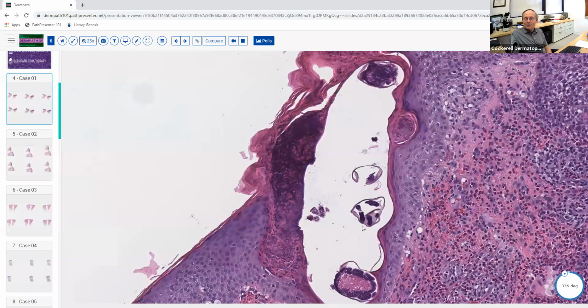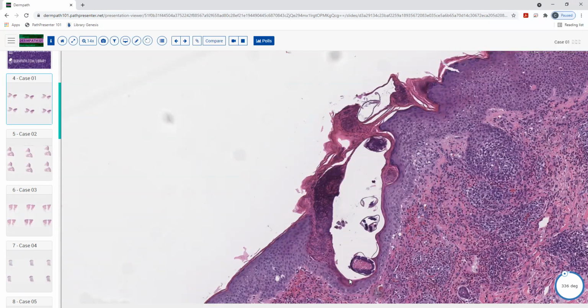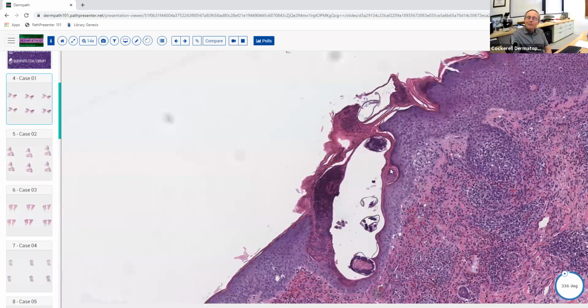And sometimes the diagnosis is just the beginning of the educational experience. So what are we looking at here? What is this, the organism, right? There's actually probably about 3 organisms here, interestingly enough. So we're looking at a little sort of apartment complex of 3, or maybe it's a duplex. It's got multiple residents in it here.